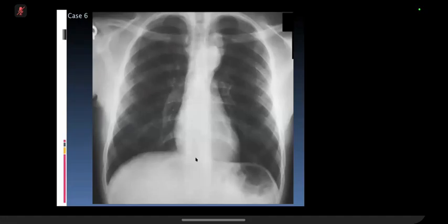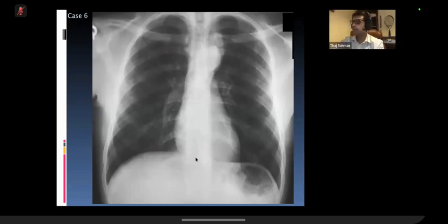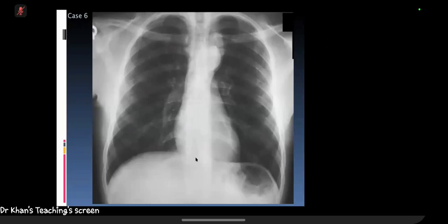So in this frontal radiograph, there is a well-defined mass in the left superior paravertebral region. It doesn't appear to extend above the superior clavicle. I can't see any calcification within it, so it appears to be broad-based with the mediastinum, so there's left mediastinal widening, in keeping with the mediastinal mass.